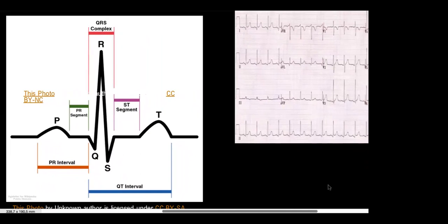Okay, so basically, we see a physiological ECG or EKG that contains a P wave and intervals. And like I said before, each and every interval is going to be important when we are discussing the conduction disorders. So the first disorder is going to be the AV block, which is also known as atrioventricular block. Next slide.